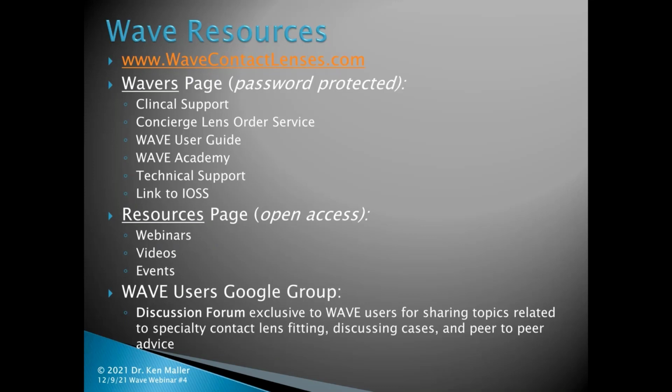Throughout all three cases, you were using the freeform view, I believe. That's correct. Is there ever a situation in which you'd use the G-Sym view, or anything not the freeform view? Yes, there is. It's a very complicated answer, so I will keep it very, very simple right now. The only time I use the G-Sym view is when I'm designing hyperopic ortho-K lenses. That's about the simplest I can make that. For everyone else, I'm using a freeform display view.